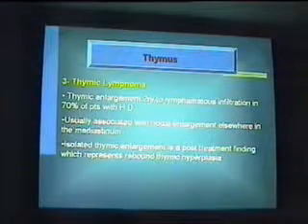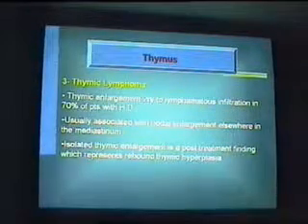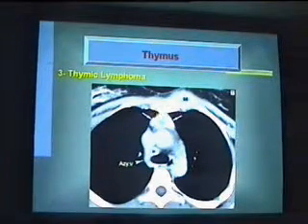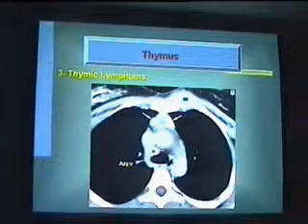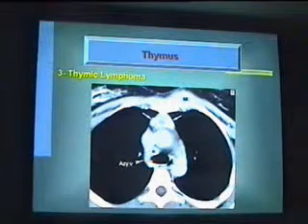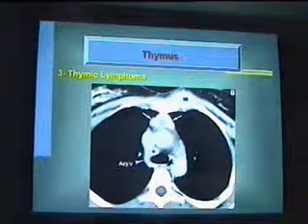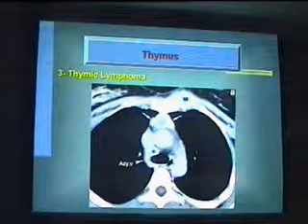طبعا in the young age group when there is still thymic tissue ما حصلوش fatty infiltration. هنشوفها بعد شوية مع بعض. And this is the thymic lymphoma. Okay, this is an enlargement of the thymus due to lymphomatous infiltration. بصوا هنا هنلاقي retrocaval pretracheal lymph node. This is the aorta. This is the superior vena cava. واللي داخل في السوبيريور فينا كيفا ده لازم من على اليمين يبقى مين؟ يبقى الأزيجوس واللي على الشمال هنا يبقى هيمي أزيجوس. تمام كده. فهنا وجود الليمفادينوباثي here may suggest that this is a thymic involvement.